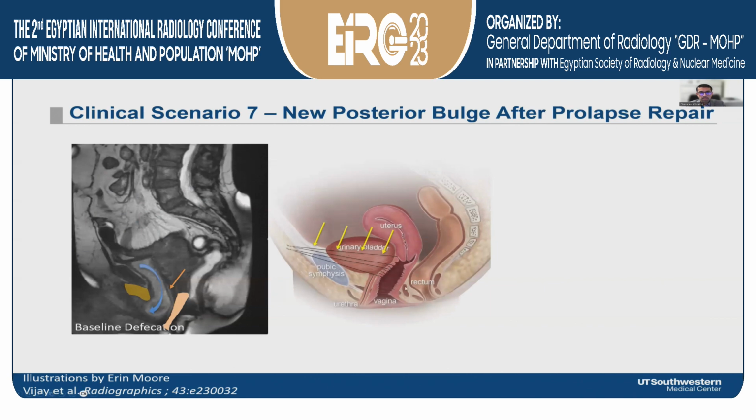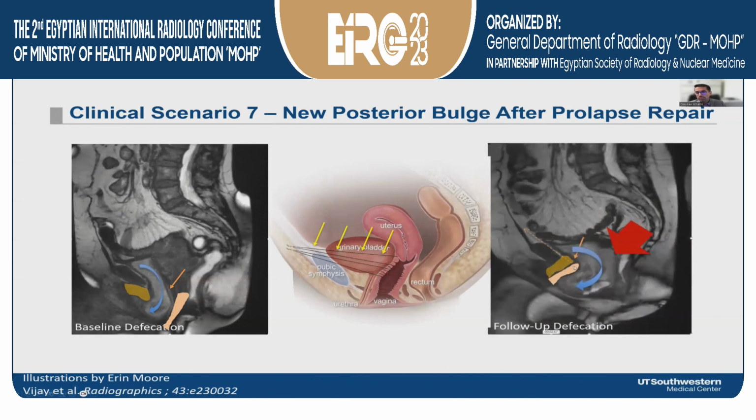And then the patient had the anterior vaginal wall suspension. And then you can see the vagina is now pulled anteriorly, which is supporting the urethra, but the cystocele is now going behind the vagina, which is very, very unusual. And so the MR defecography was instrumental in demonstrating what was going on here.